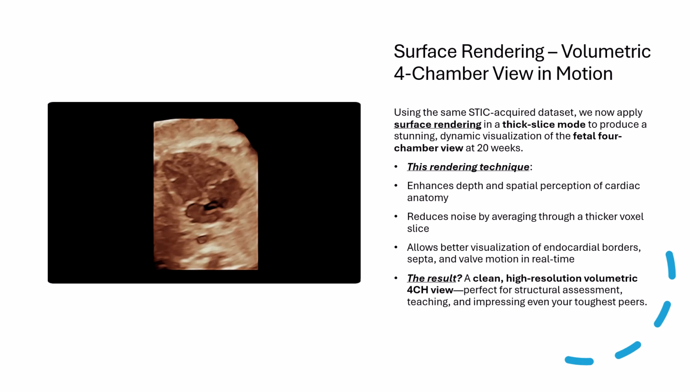What we can achieve is not just another image, it is cinematic quality volumetric rendering that serves as a powerful tool for diagnosis, education, and even professional peer review. This level of visual clarity and anatomical context elevates our assessment capability, moving us from conventional sonography into the realm of next generation echocardiographic imaging.